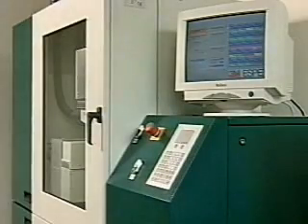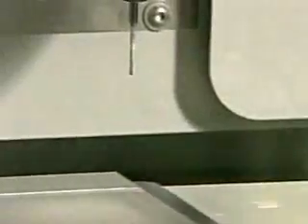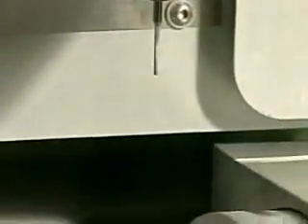The frame is cut from a pre-sintered zirconium oxide blank in a chalk-like green state, from which the machine can process up to 21 consecutive pieces thanks to the magazine. Hard metal tools are used for cutting. They're very long-lasting because zirconium oxide that's only pre-sintered is still relatively soft and therefore easy to cut.